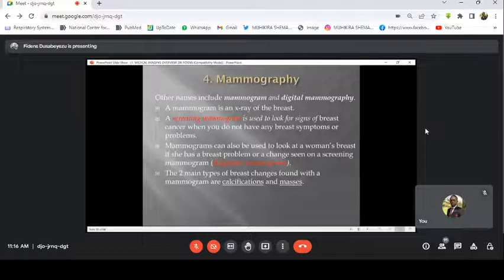If even a tumor is white, how can we differentiate both? So it is useless. But for old people, the content of the breast is 90% or even 100% fat, and fat is gray.